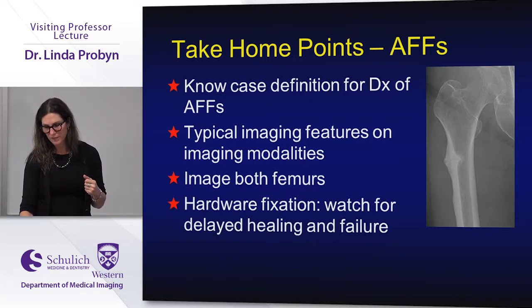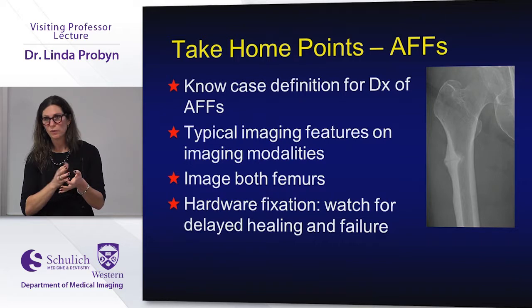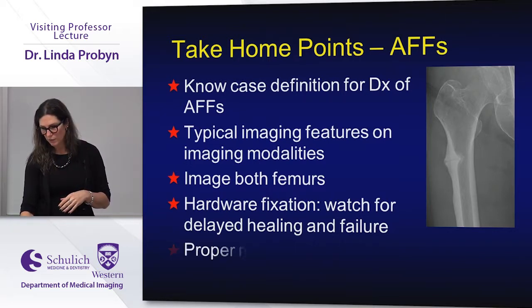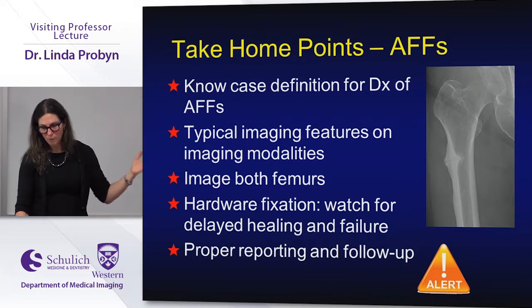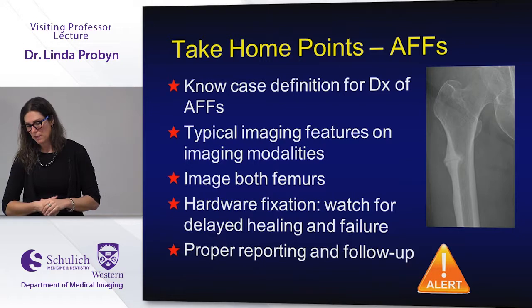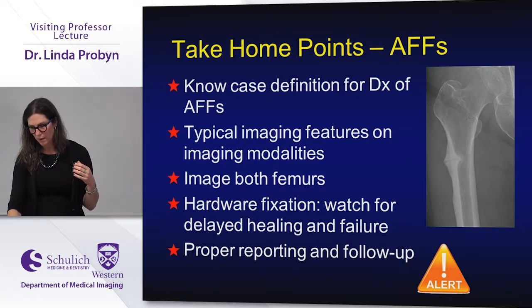When they have hardware fixation, we definitely need to watch for delayed healing and for failure. Really look for subtle bending of screws and little cracks in screws. We've definitely seen some subtle hardware failure in these patients. Proper reporting and follow-up are also key to decreasing the morbidity and mortality in these patients. And there's the ALERT program there.